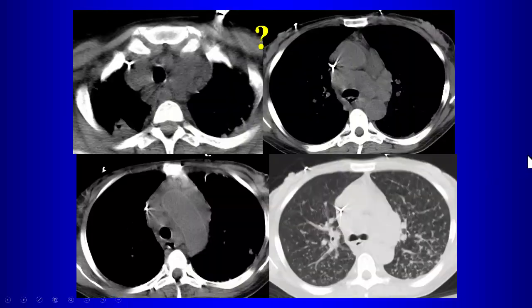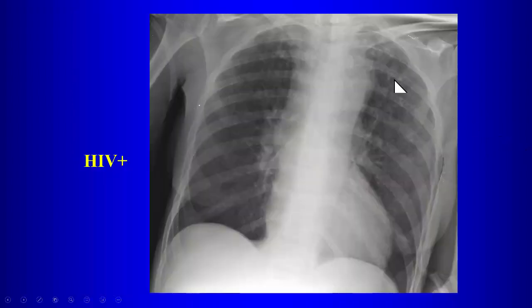Lymphadenopathy. So here's the CT on this case. What are the findings on the CT? Mediastinal lymphadenopathy? Yes, so we see now the reason for the wide mediastinum. We can see all of this mediastinal lymphadenopathy. On the chest radiograph there were some ill-defined opacities, especially there in the left upper lobe.